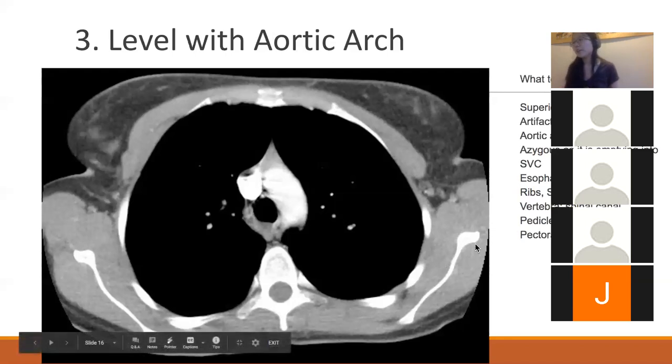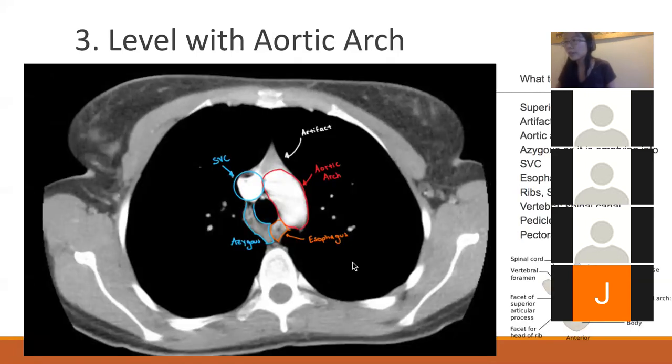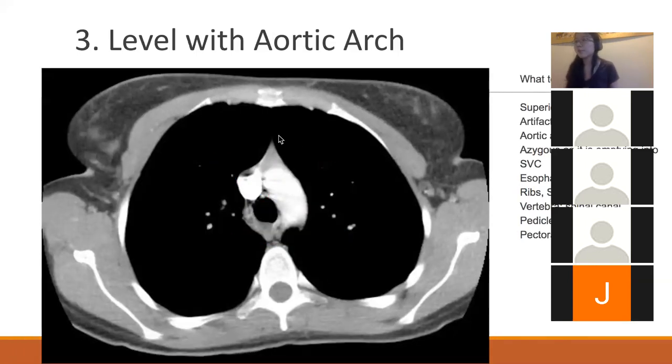It's hard to really differentiate which muscles those are, but your subscapularis is going to be the big one that sits on top of the other two, about right here. Okay, I think those are all the structures in this region. Just about. And this funny cone thing here is just an artifact from the way that the image was taken.